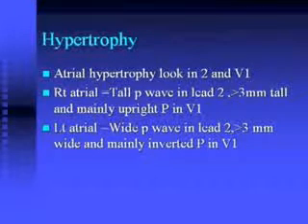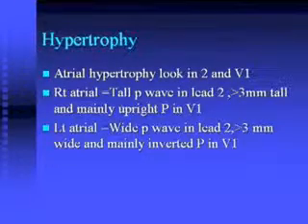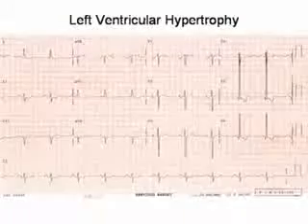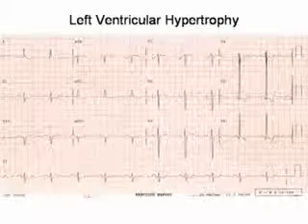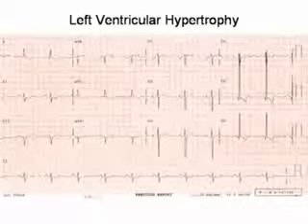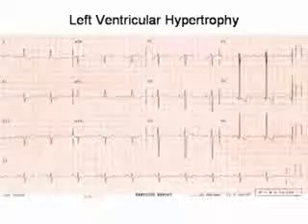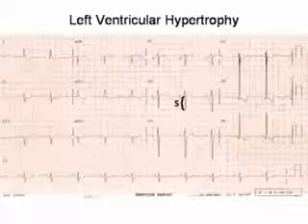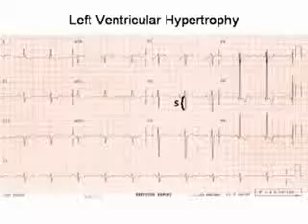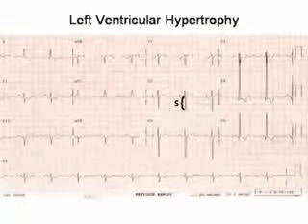The slide is titled left ventricular hypertrophy. And if you take a look at the criteria, again picking the largest S wave in V1 or V2, I would pick V2. And the largest R wave in V5 or V6, I would pick V5. You can add those two together and clearly they're greater than 35.